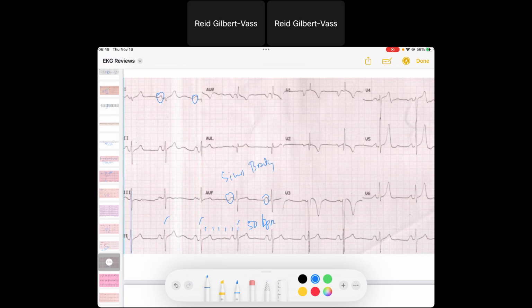Okay. If you look at these P waves in V1, look how negative they are. It's a large negative component to the P waves in V1. If you go back and look at one of my lectures that I'll be posting about atrial abnormalities, we know that deep negative P waves in V1, V1 is capturing the negative portion, the atrial component of depolarization for the P wave. And so this would be left atrial enlargement. And so that's one finding that we have here.